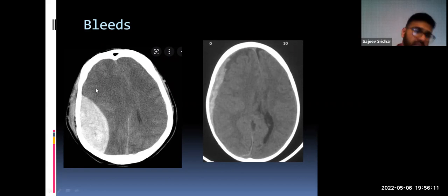So in this case, we can see that the patient had some kind of knock on the right-hand side of the brain. And you can see the subcutaneous hematoma that has formed on the side of the head as well. And obviously there must have been some kind of knock on the left side as well, because you can see a sliver of subcutaneous hematoma over here too. The key thing to note is this is acutely clotting blood. But even within this acutely clotting blood, you can see instances of this darkness.